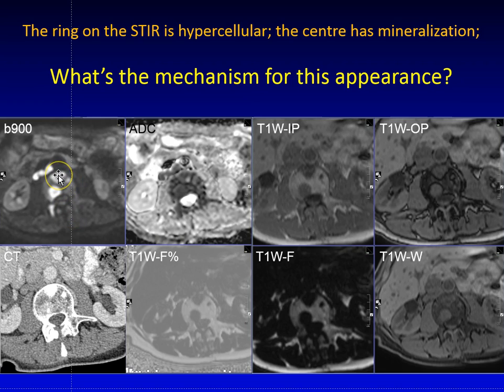Now, axial images through 2 lesions are shown here. So you can see that there are 3 metastases in this particular vertebral body, but if you just concentrate on this anterior and posterior lesion, you can see the anterior lesion, which is the more calcified lesion, is in fact less hyperintense than this posterior lesion. The posterior lesion has a small area of nidus in the back, or mineralization, and here is that mineralization with this halo around it on the CT scan.